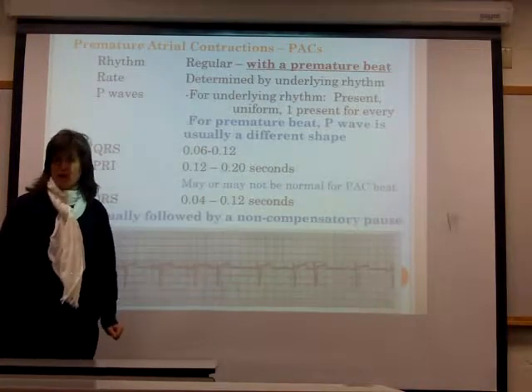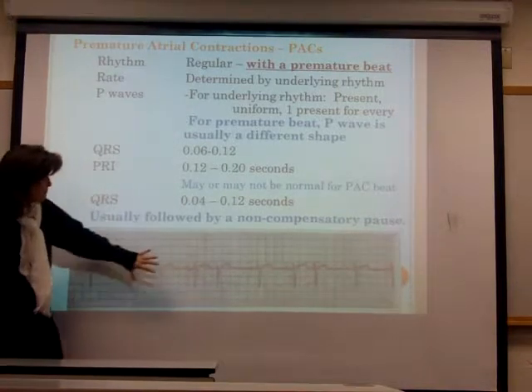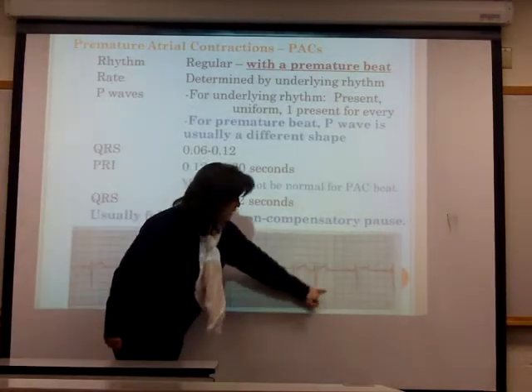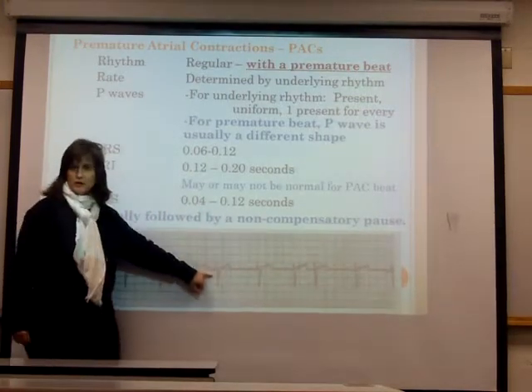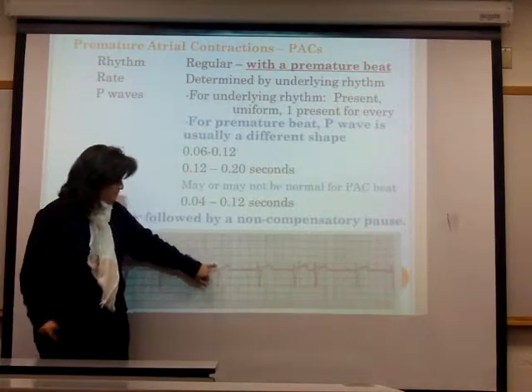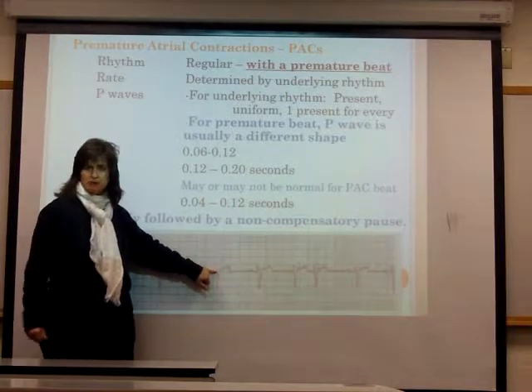That's it so far. But I also have to address, this is a complex, a complex, a complex. So 1, 2, 3, 4. What happened at the 5th complex, 6, 7, 8, and what happened at the 8th complex. So I look at the first early complex. Again, it's early. I look at my P wave. It's upright. My QRS is very narrow, so I know the complex started above the ventricle.